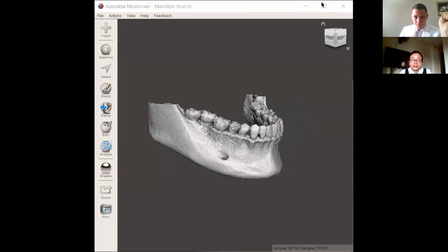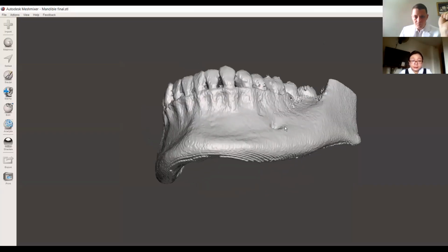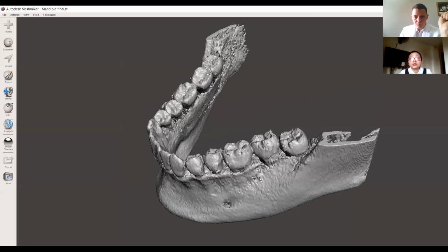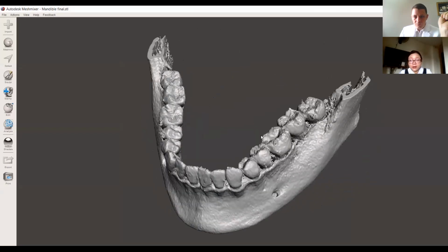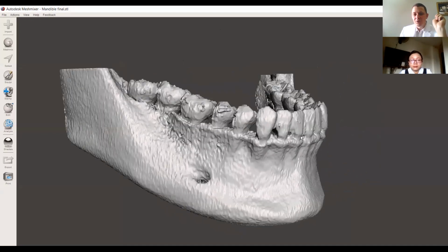Okay. So here. No, it's not true. It's not the right file. No, it's not this. Yes, because in fact this one is from the hard one. This is the hard one, but it's supposed to look like this more or less.